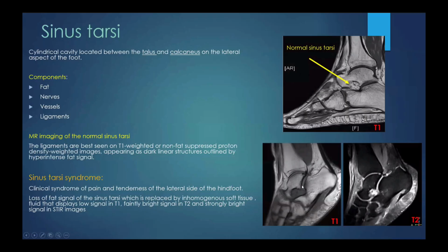Sinus tarsi syndrome is a clinical syndrome of pain and tenderness of the lateral side of the hindfoot, where we can see loss of the fat signal in the sinus tarsi. Here, these are the same sagittal T1 weighted images, and we can see the difference between the two cases. The first one has preserved fat signal intensity, and in this example we lost the fat signal intensity, and it's replaced by inhomogeneous fluid signal intensity, representing sinus tarsi syndrome.